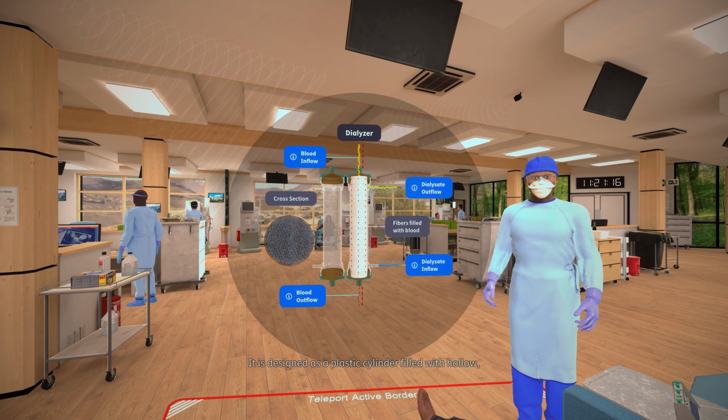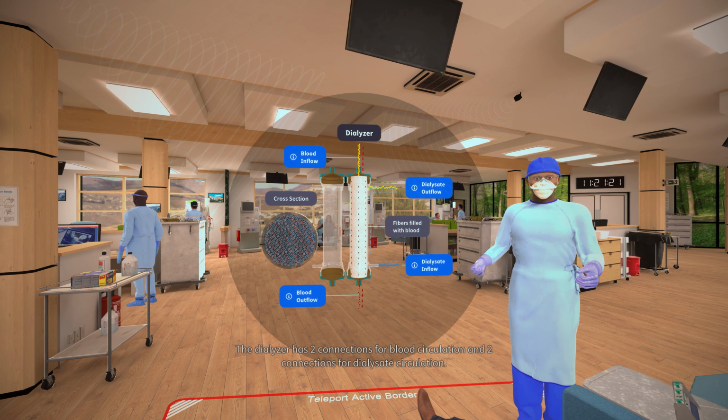It is designed as a plastic cylinder filled with hollow, semi-permeable fibers. The dialyzer has 2 connections for blood circulation and 2 connections for dialysate circulation. The purpose of the dialyzer is to remove excess water and wastes from a patient's blood, once the kidneys can no longer handle the process.